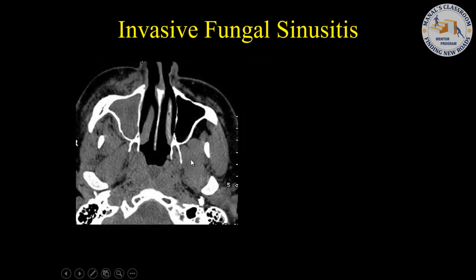This patient has it. Now, this patient has a chronically diseased right maxillary sinus, but someone has to tell me, how do I know that this patient is at very high risk to have invasive fungal sinusitis? This is probably the most important slide of this whole talk.